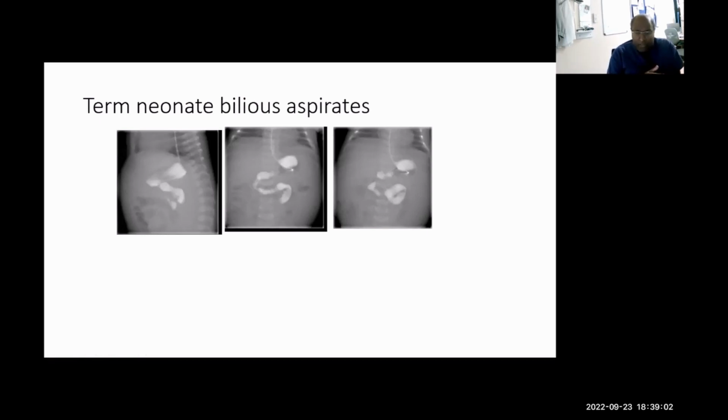And why do we do ultrasound? Is because ultrasound helps to complement to find out on two things. One, can you predict the retroperitoneal course of the duodenum? Two, can you see the normal SMA-SMV axis? Three, do you see a whirlpool sign to say, oh, can this be a volvulus? And four, look for any other cause which could be causing bilious aspirates, because any retroperitoneal abnormality can cause bilious aspirates.